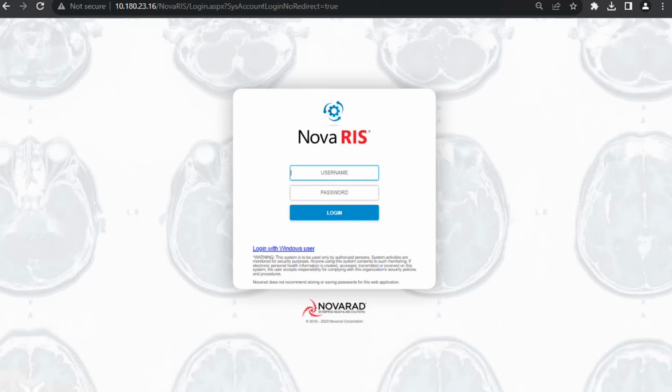In different cases, some of you will only log into the PACS and will never log into the RIS, but we will show you that if you have the RIS, you can also log in and see some of these features, how your site is managing that information, and what information you have available that you might be able to use to enhance your workflow when you are reading your procedures.